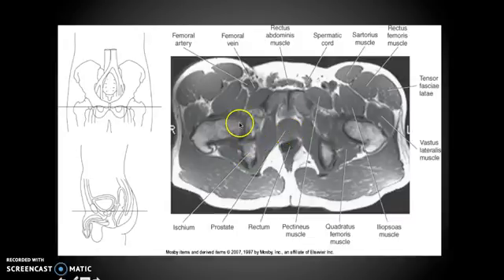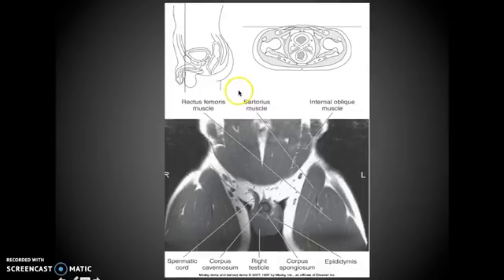Your ischium is there. So looking at this image here, I wish my muscles looked like this. Clearly they don't. So here is your internal obliques. This is your rectus abdominis here. This is your sartorius muscle, and you can see your rectus femoris.